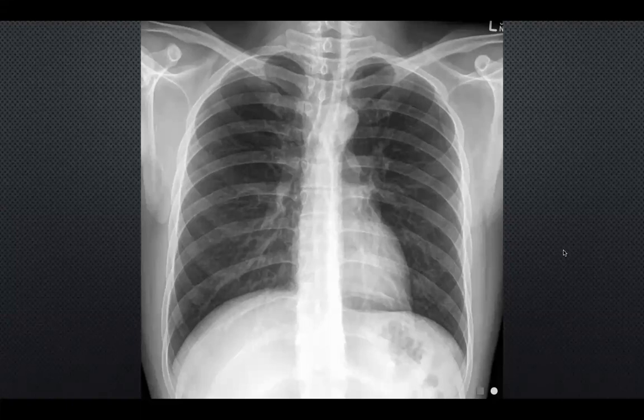That's fine. Okay. If we look at the start of the X-ray, then it should be taken in, if I am not wrong, posterior anterior, and there are the clavicle bones that are visible. If I'm not wrong, I'm just a little bit confused.